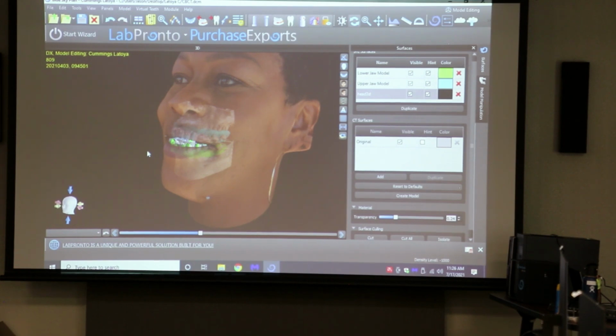Yeah. No, where is it? That guy. So you have this selected. Remember, you got to select. Yeah, that's fine. All right, I'm going to go to the next slides and finish up.